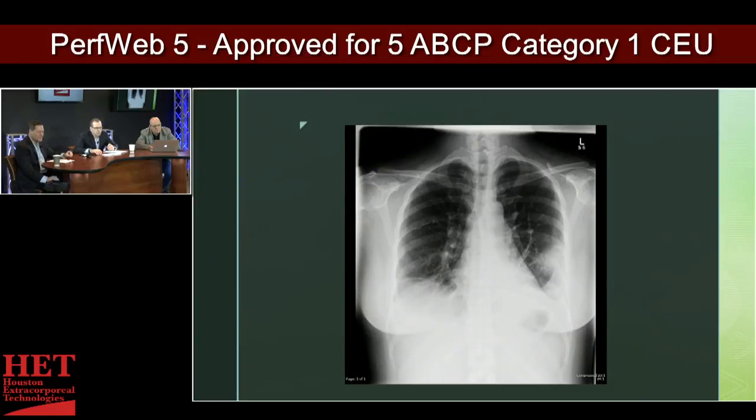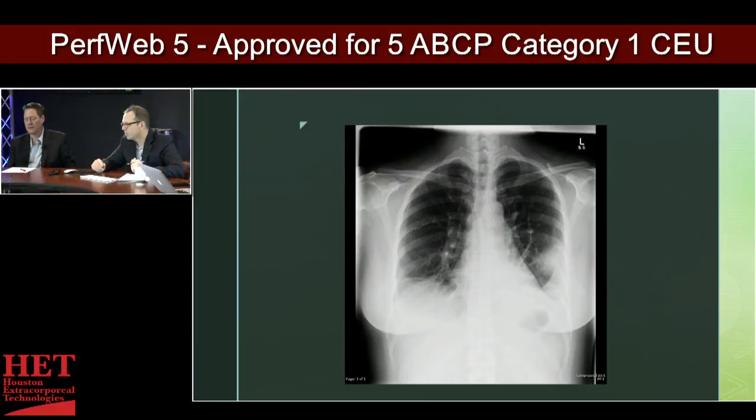Right. I don't know in this projection that it sees anything, but you could see pneumopericardium there. That's where that would show up. Okay. Anytime you see an acute interface between white and dark, that's usually kind of an air tissue interface. And so we'll have a couple of other films coming up that will show something along those lines.